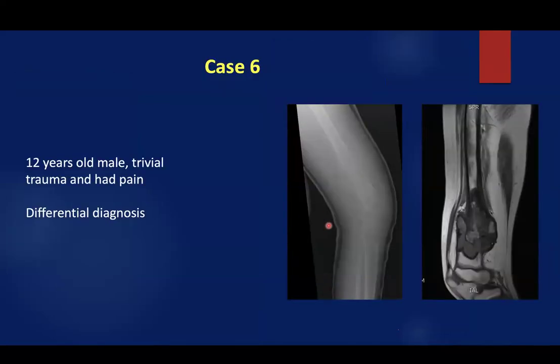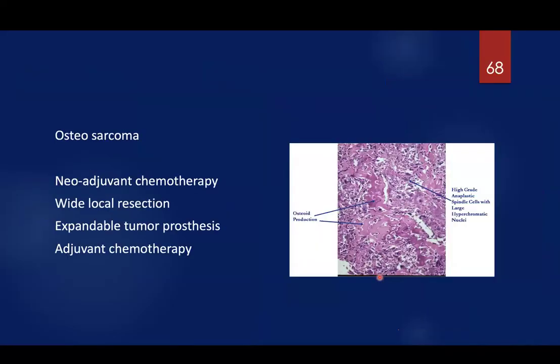So another patient, he's a 12 years male patient, has a trivial trauma, subsequently complained of severe pain. And typically, if you look at this X-ray, you know that this is malignancy. There is permeative pattern of bone destruction, periosteal reaction. So we immobilized him, and the differential diagnosis of any malignancy in pediatric population is osteosarcoma, Ewing sarcoma. In more older population, we add bone lymphoma, infection, of course, but it turned out to be osteosarcoma, and he developed a fracture that healed after chemotherapy.